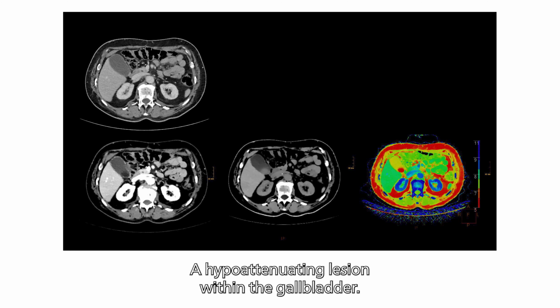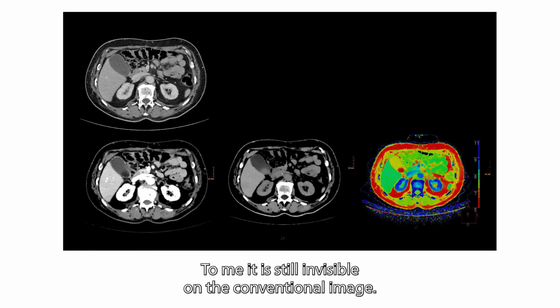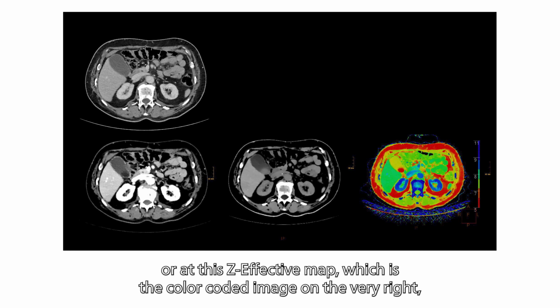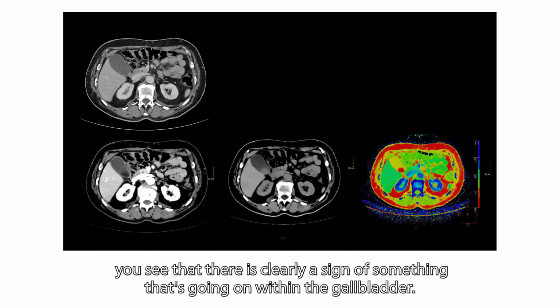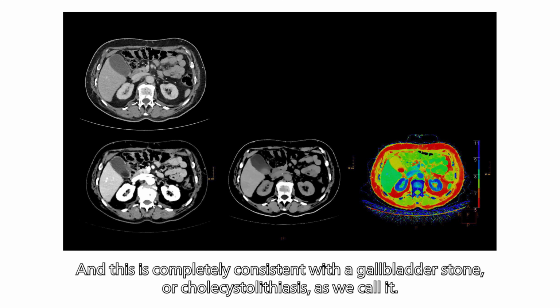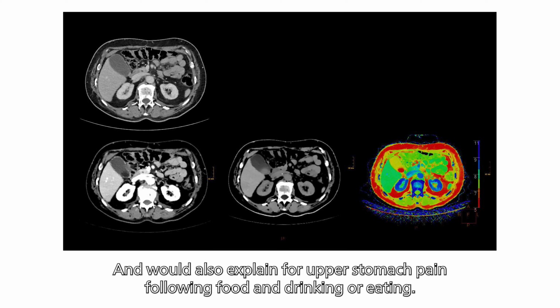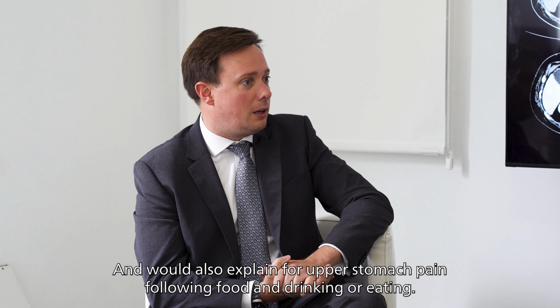Hypoattenuation. The hypoattenuating lesion within the gallbladder, right? It's clear. To me it is still invisible on the conventional image, but when you then look at the electron density map, that's the image in the lower row in the middle, or at the Z-effective map, which is shown in the color-coded image on the very right, you see that there is clearly a sign of something going on within the gallbladder, and this is completely consistent with the gallbladder stone, or cholelithiasis as we call it, and would also explain upper stomach pain following food and drinking or eating.